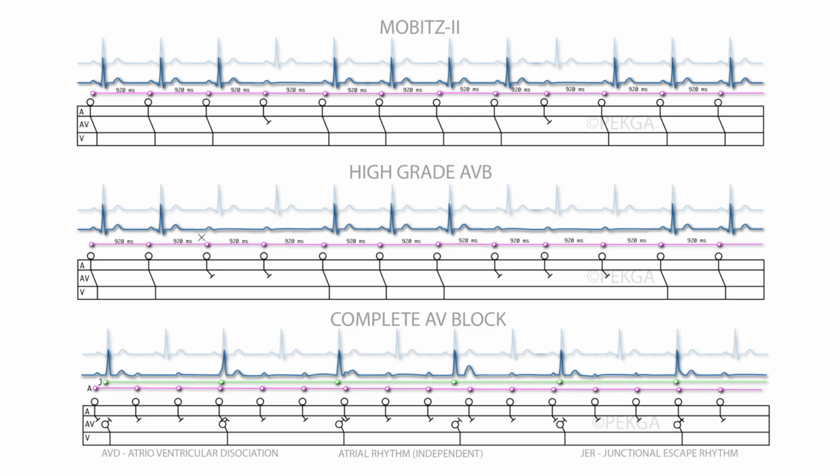We have to start talking about ventricular standstills and what is a complete heart block and so on and so forth. Even though down here, this is one version of it, right? You get P's all over the place, and then there's an independent rhythm, a lower pacemaker that's firing at the same time.